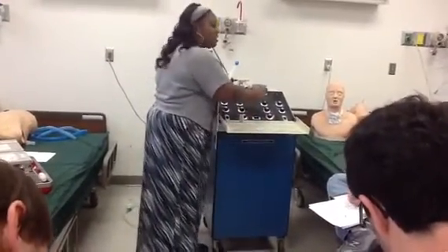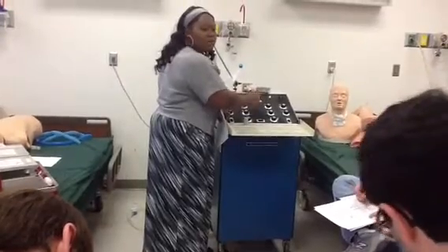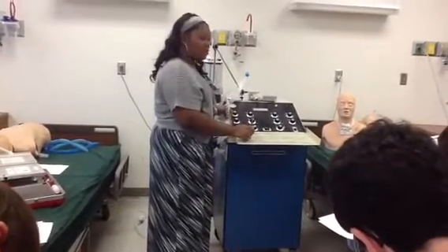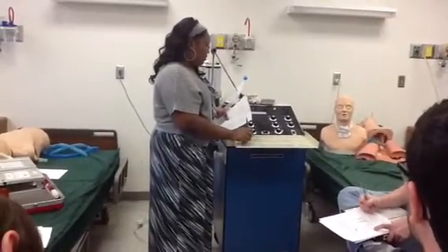Sigh pressure limit, that's also an alarm. That would be how high the pressure could go before the vent lets you know during a sigh. That's G. K is your O2%. Goes from 21 to 100%. L is expiratory resistance. Don't touch it. You don't need to know it. Just, right, don't touch it.